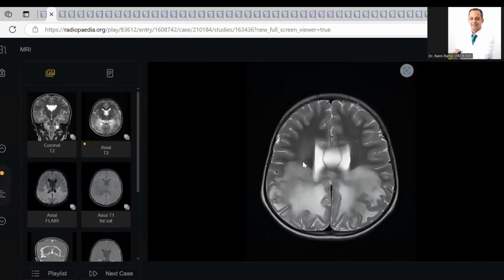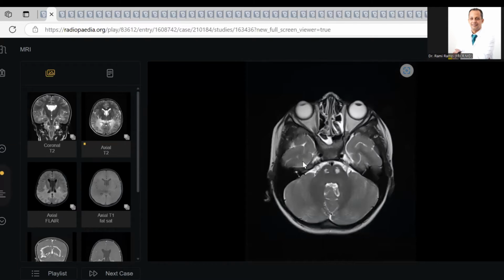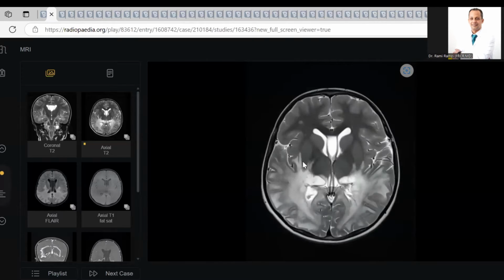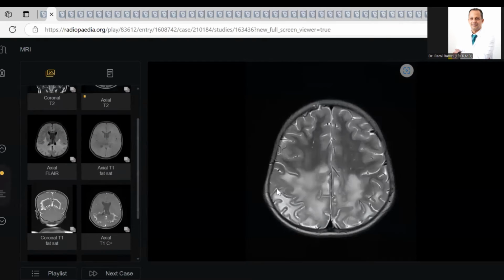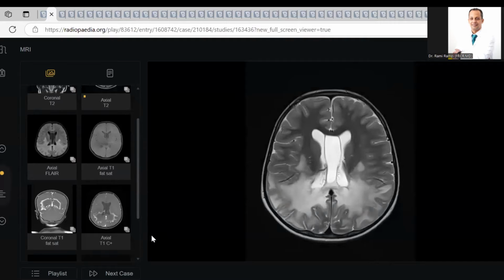Okay, so in a 10-year-old with bilateral symmetrical white matter hyperintensities extending up to the subcortical region, I would first think of a leukodystrophy. And since it is occipital predominance, extending towards the frontal area, occipitofrontal progress, this may be adrenoleukodystrophy in a 10-year-old.